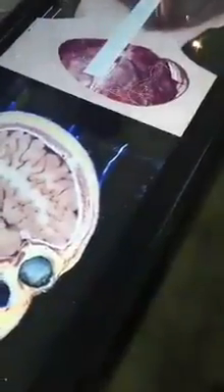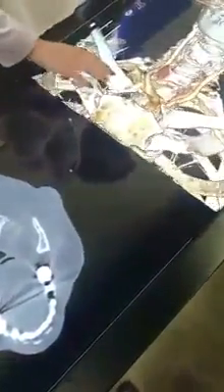So everything you see here is what we saw at 0.6 to 0.8 millimeter thickness. And so each time I turn around, slide through the sections, I can see where it lies. And you're not just limited to the head and neck, you also have areas like the brain, large areas like the thorax and the abdomen, all the way down to the leg and foot. And what's most interesting to me is you can load in your own patient CT or MRI scans, and from there you can get a 3D model of what you're seeing.